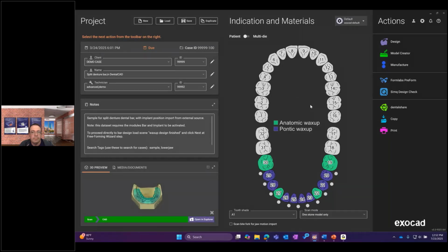So if you want a specific geometric shape or profile, then you should utilize that bar profile option so you can incorporate that with the split bar. Other than that, there were a couple of specific questions that I think we'll have to follow up on, just to see the behavior a little more, that in-depth stuff the testers are seeing.